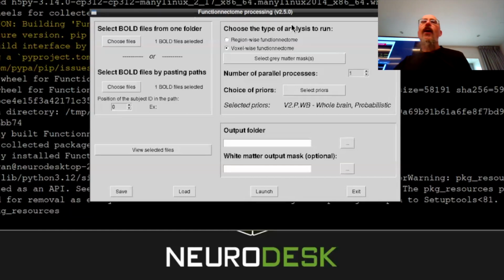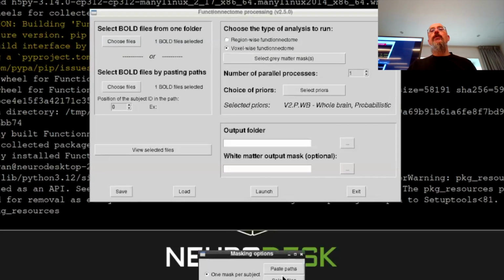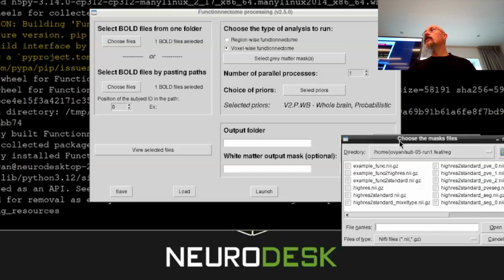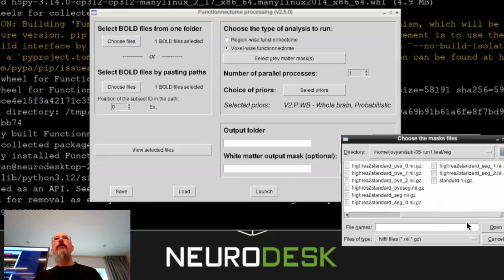So you need to select a gray matter image, which is in the standard space too. Normally, if you did it last time, but I can show you again. You go there and you select one file, and this file should be in the right folder. After the segmentation, if people didn't do it, I can show it. Everybody has a segmented image? The image to segment is the high resolution to standard.